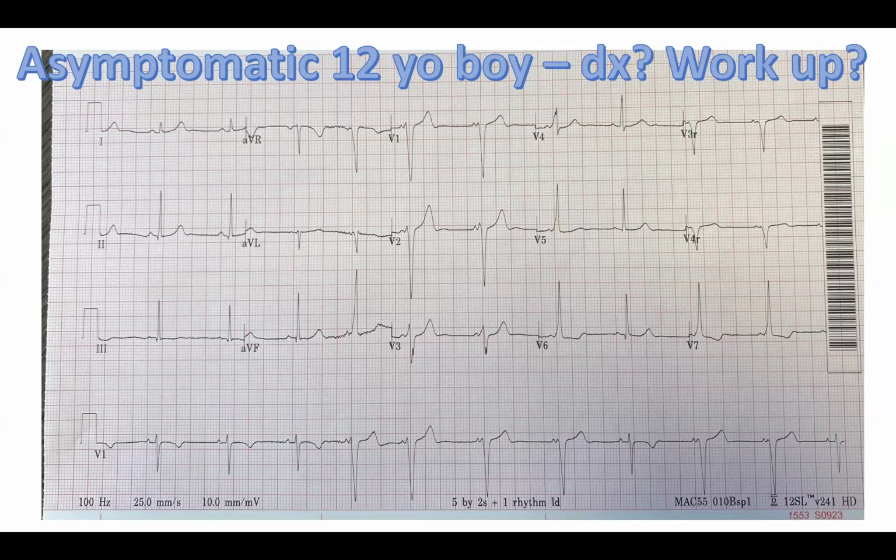Good morning, Dr. Pass. Morning. Looking at this EKG, it looks like we're in sinus rhythm. And then just looking at the rhythm strip, I believe those are PVCs.